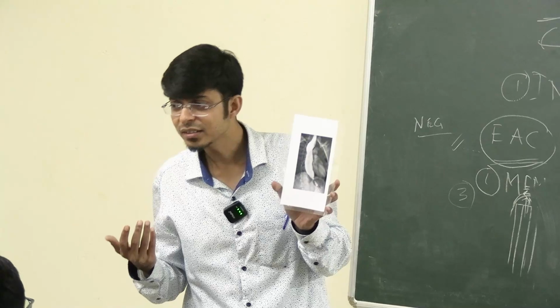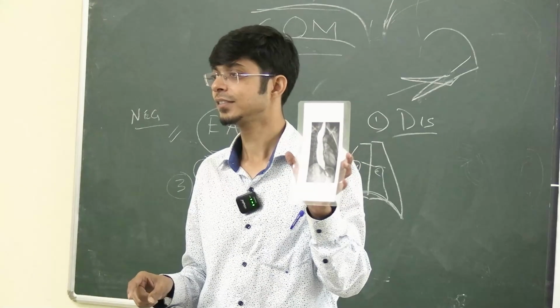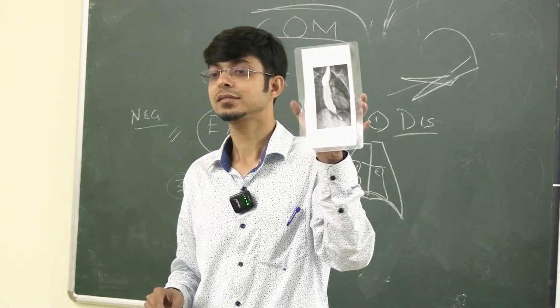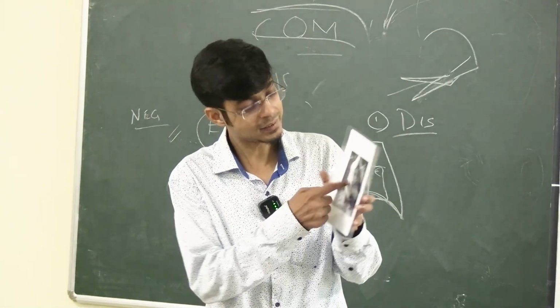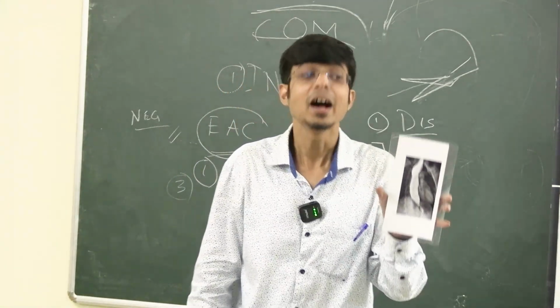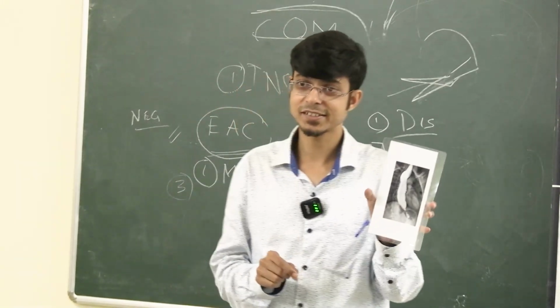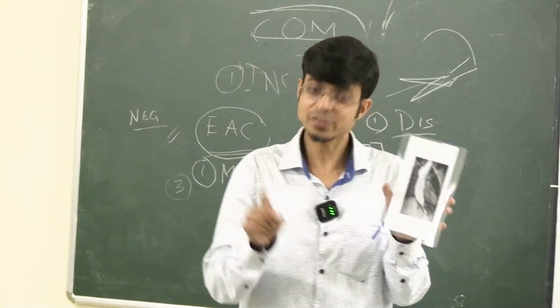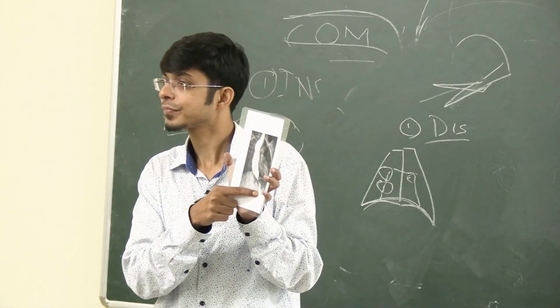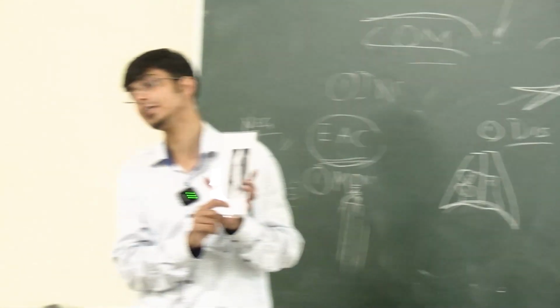Tell me. This is a barium swallow X-ray of the esophagus showing Achalasia Cardia. It is written Achalasia Cardia here. But a sudden narrowing of the esophagus or a bird beak appearance in the distal esophagus, very good. The acute narrowing of the distal esophagus. Okay. Most likely this is a case of Achalasia Cardia.